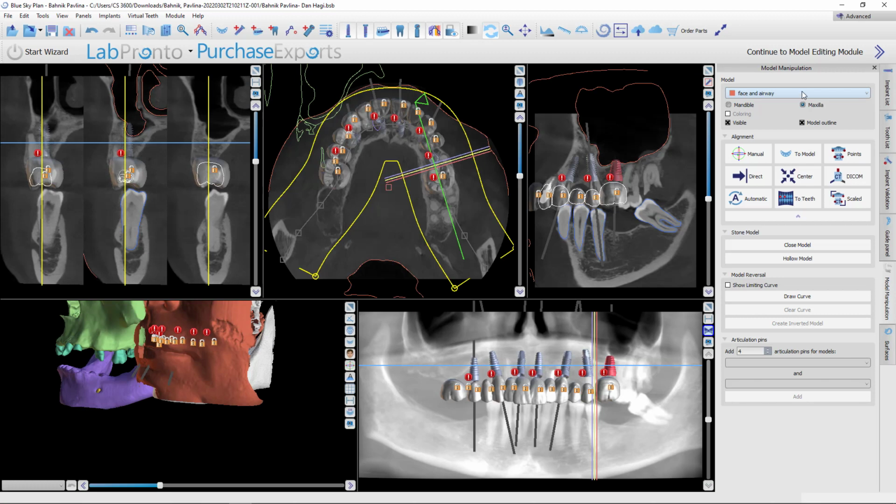So basically, when I get these segmentations back, I usually do a couple of steps first. Every individual tooth is going to be its own STL. I'll usually open those individual teeth in Mesh Mixer and combine them into all the upper teeth and all the lower teeth. I will typically join the maxilla and the cranial bones, and then everything else I just bring in as it comes from Diagnocat.